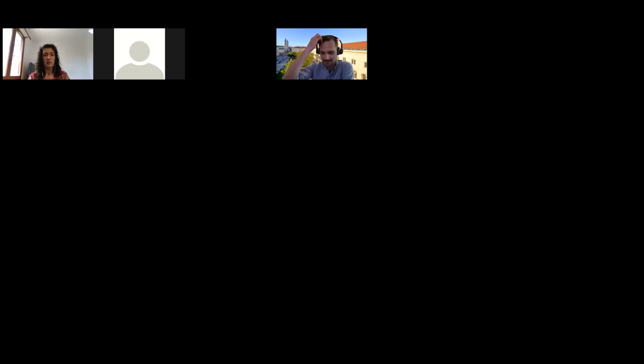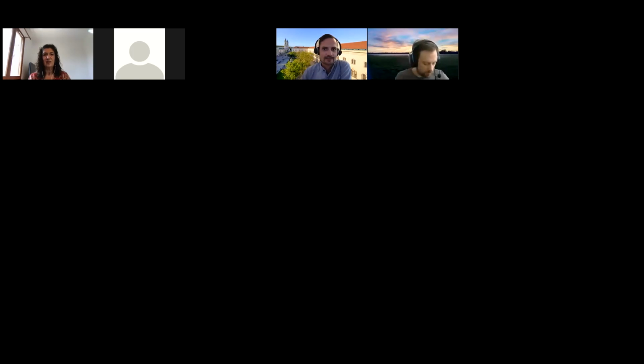So we decided to basically continue with the pace we had yesterday. Better setup for everybody than the day before yesterday. As you probably know by now, by the lectures today, it's about radiobiology. And so we will now also cover this aspect. Yesterday we covered uncertainties, and today will be about radiobiology, also with an emphasis on carbon ions. I will share my screen.